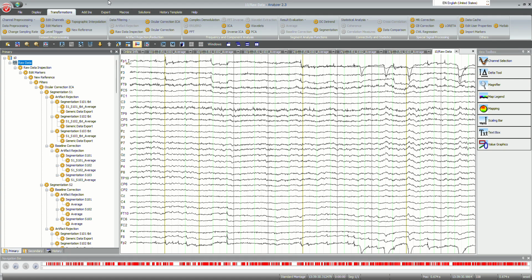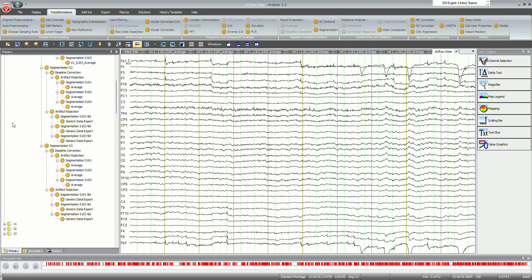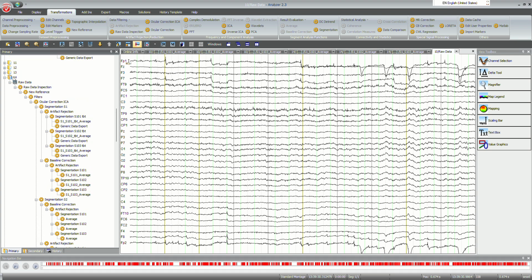We'll look at our groups next, but per group, per grammatical property, and per grammaticality condition. So we'll be looking at that, right? So per group, our groups will be 2 sets of participants. We'll make the division next based on the IDs, the numbers of the participants, which are the topmost reference node. So 10, next one will be 11, 12, 13, 14.